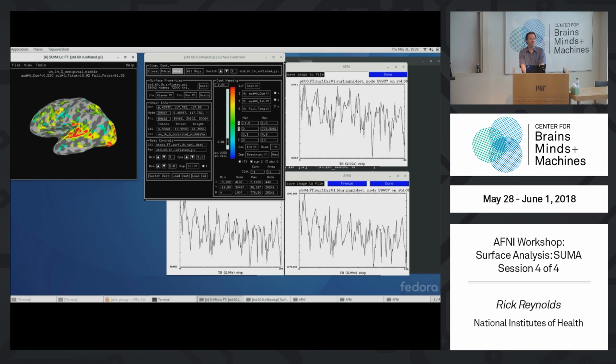Let's take a break and come back, and I'll show you this data in MNI space. We're in single subject space, but remember this is also sort of a group space. I use MNI coordinates, so I will try to make those things a little more clear when we come back.